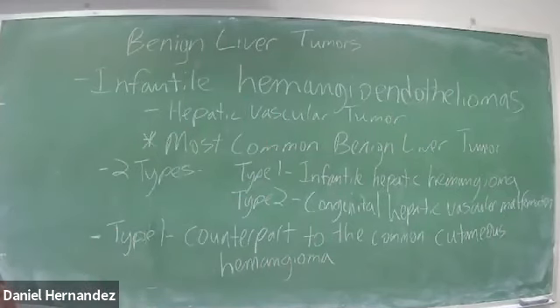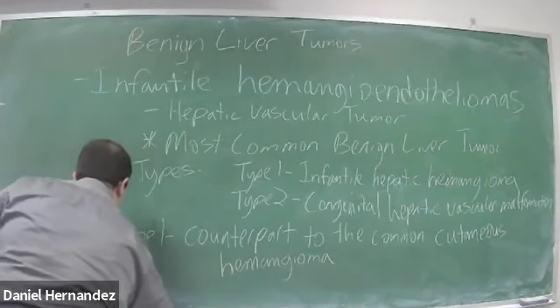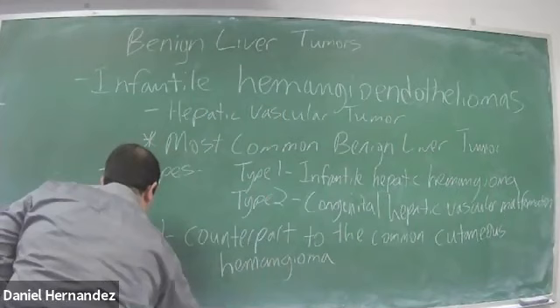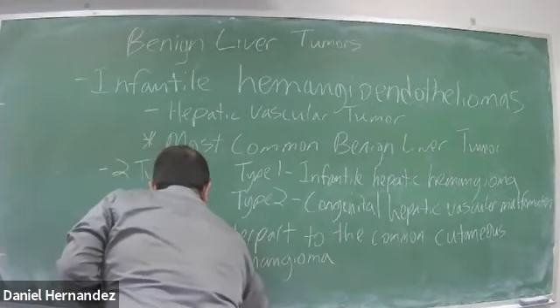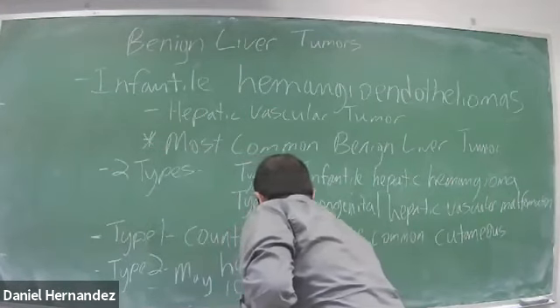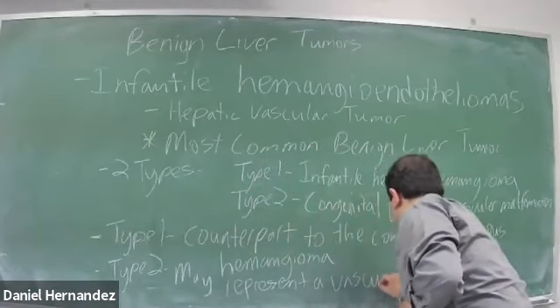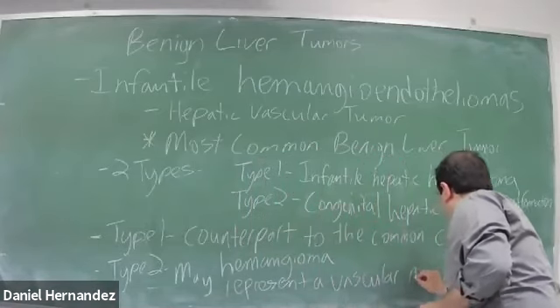Type 2 may represent a vascular malformation.